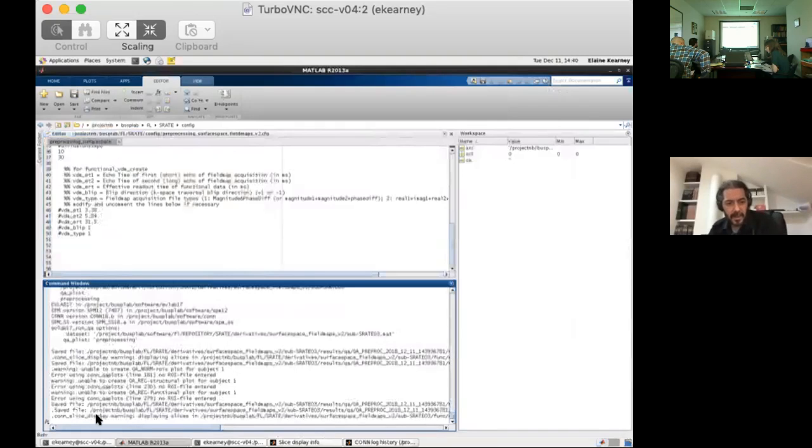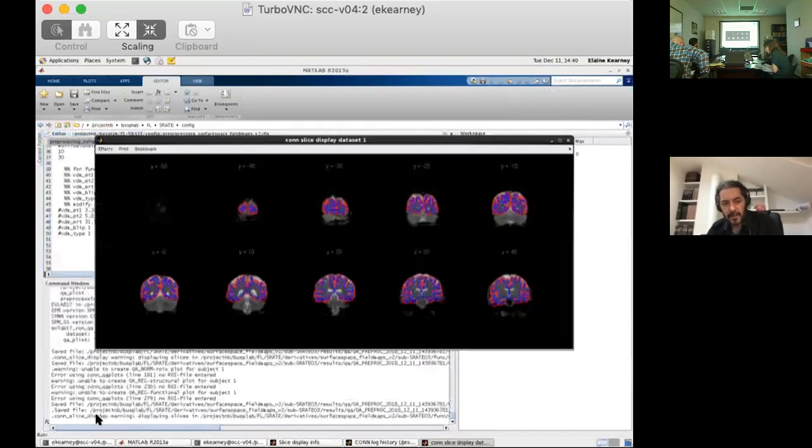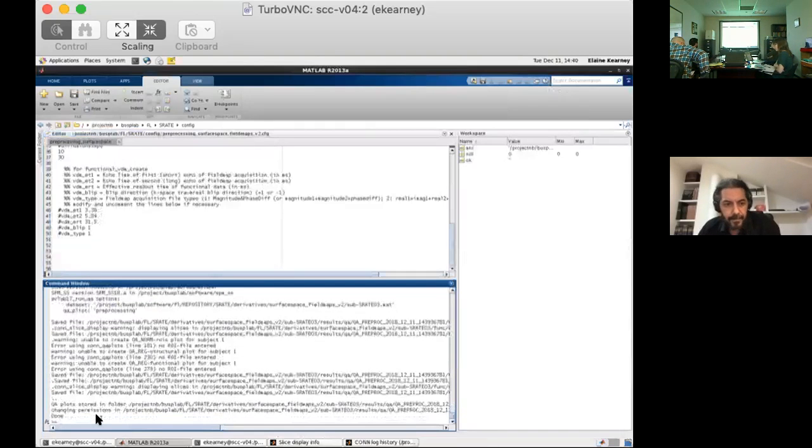There are a number of plots that are giving you an error message, but that's fine. That's just because it doesn't have any gray matter regions that result from the segmentation step, because we didn't actually run segmentation. So that's fine for this pipeline. Okay, there. Yes, right. If you can just go to the next.